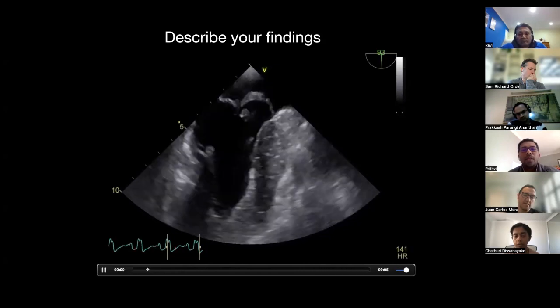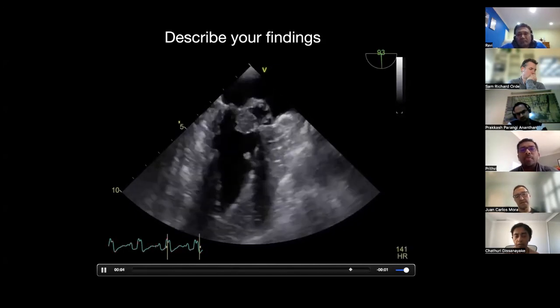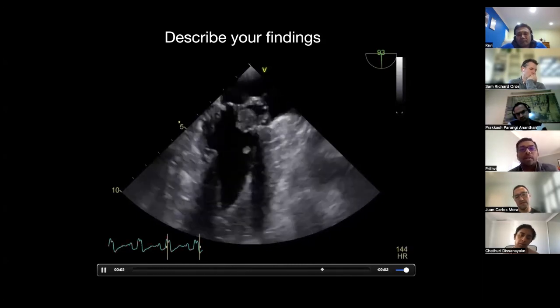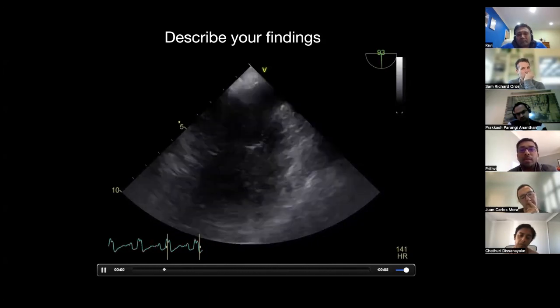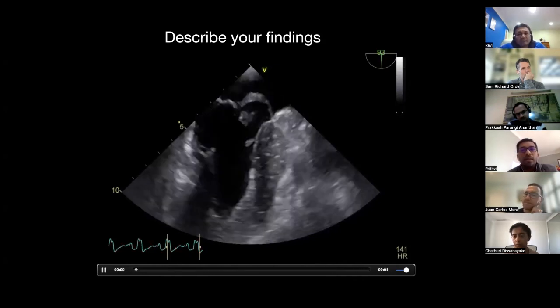So with this anatomical abnormality, I would expect a severe mitral regurgitation as a cause of the hypotension. That is inconsistent with the LAD and the circ infarct.